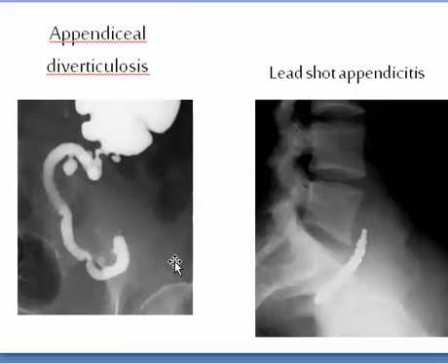This is appendicular or appendiceal diverticulosis, in which you can find diverticula in a long appendix. A long appendix is a sign of appendicitis. Here is a case of appendicitis, where it forms a lot of calculi.